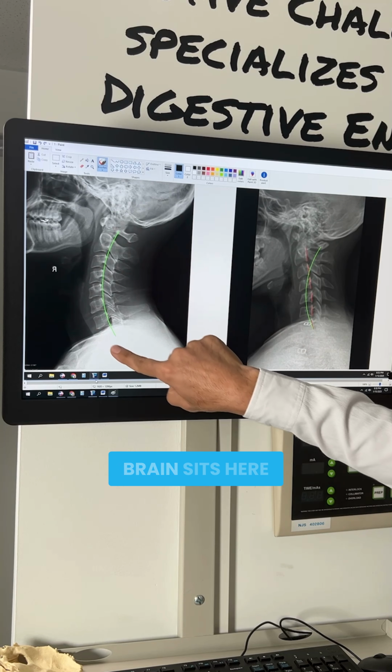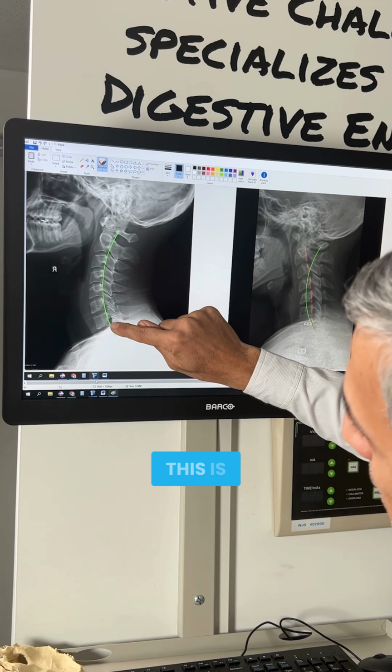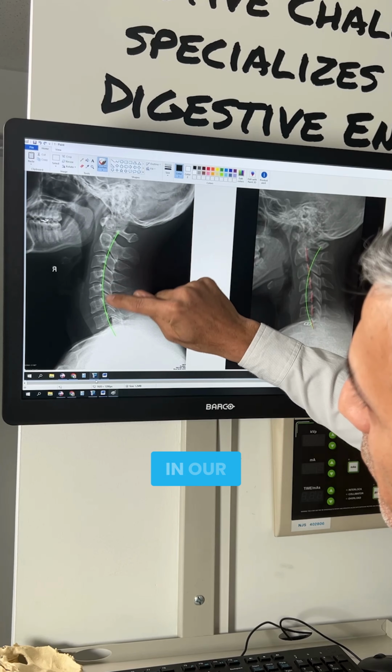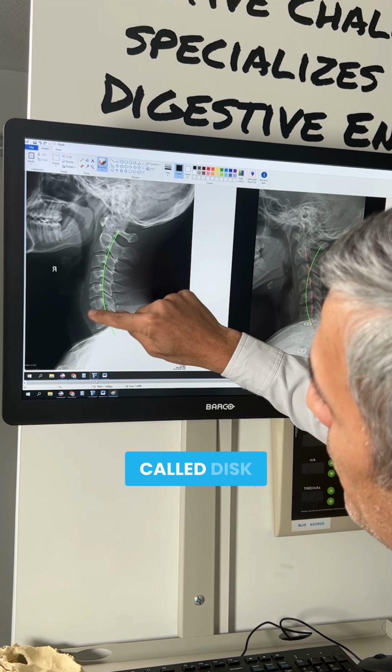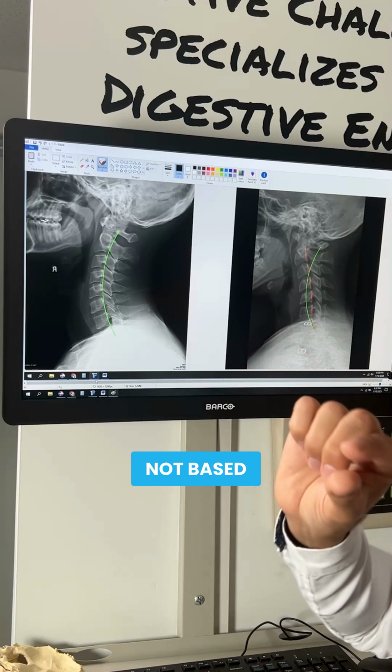Very important, your brain sits here, and the spinal cord passes through. In between each bone, this is a vertebra. We have 7 different vertebrae in our cervical spine. In between each bone, we have what's called disc space. On x-rays, we cannot see actual soft tissue or disc, but we can see the disc spaces. When we're seeing disc spaces, we can predict whether the disc is compressed or not based on that space.